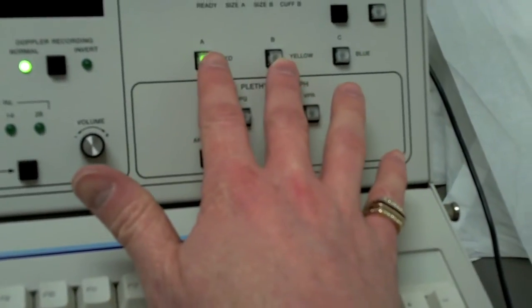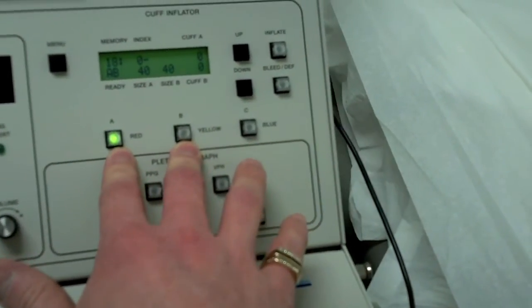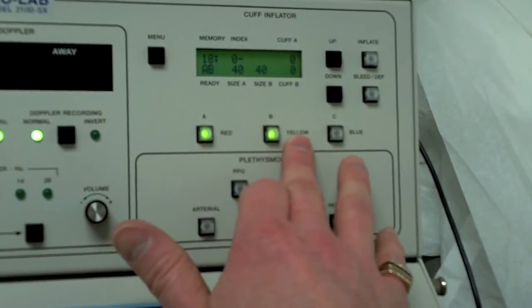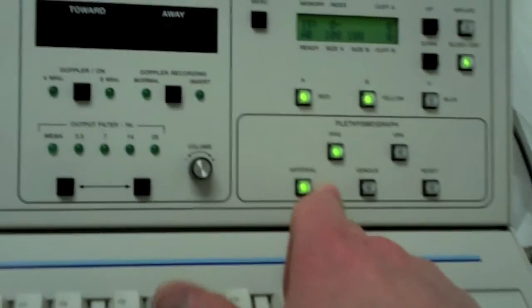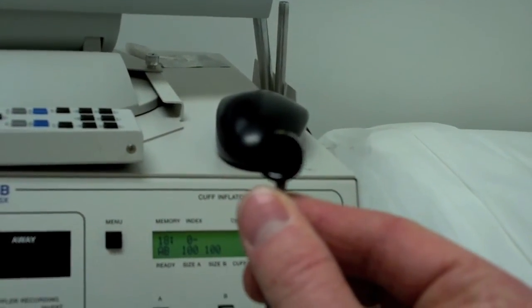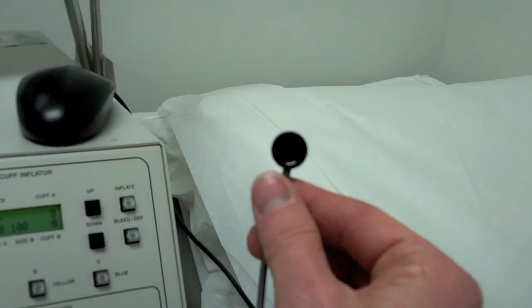But here's a red and a yellow, so that you have red, which is the right cuff usually, or the right side of connectors, and then the yellow ones with this side on the B side, or the yellow connectors here. And if you're doing plethysmography or want to activate the PPGs, you can always come down here and push PPG, and then it's going to be looking for signals coming from the PPG probes, which you can see are these here with the 2 detectors on either side. This is the infrared light PPG connector that you can hook on to usually the digits.